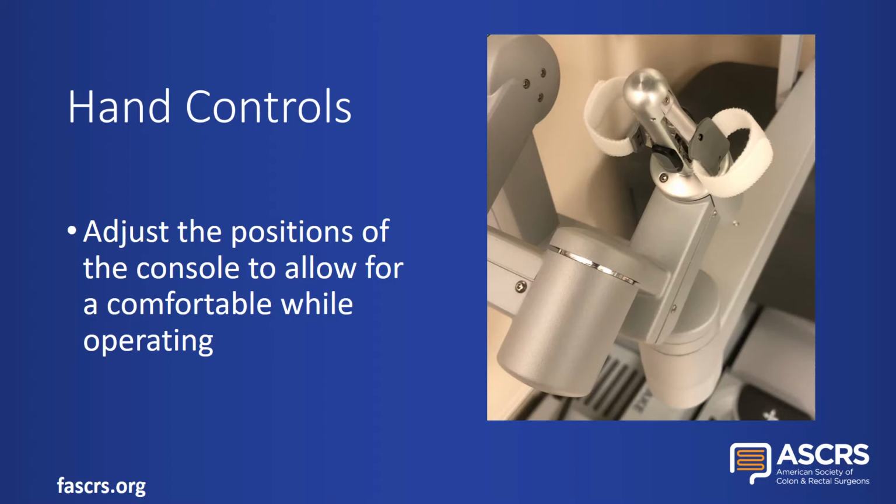In addition, there is a finger clutch, which when depressed, disengages the hand controls from the robotic instruments to allow the hand controls to be repositioned to optimize reach or movement of the instruments, while maintaining optimal ergonomics.